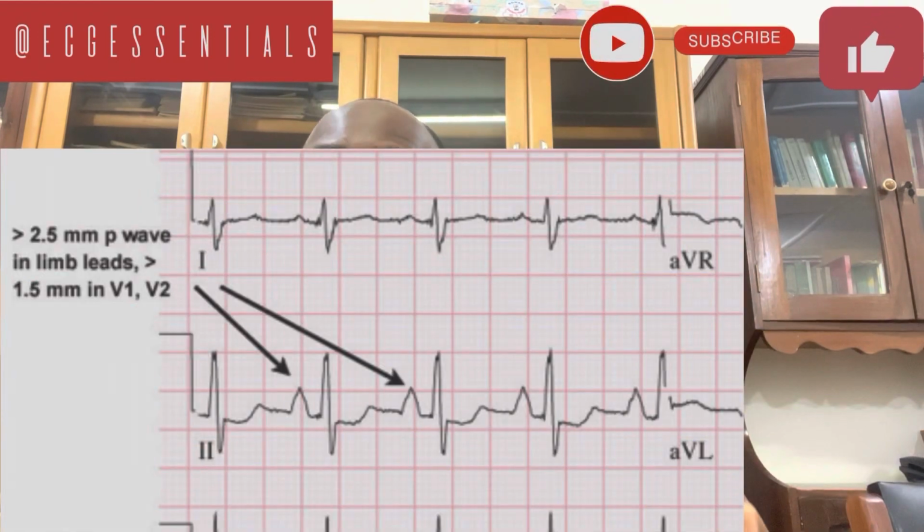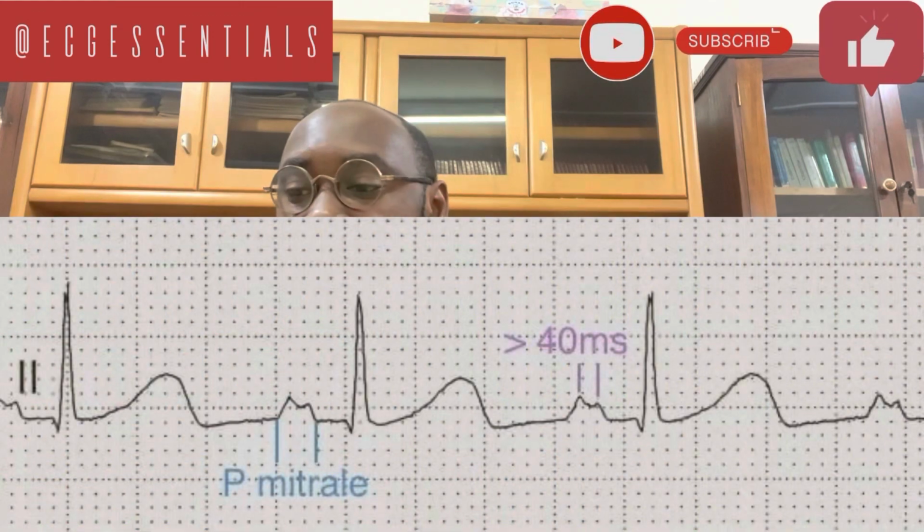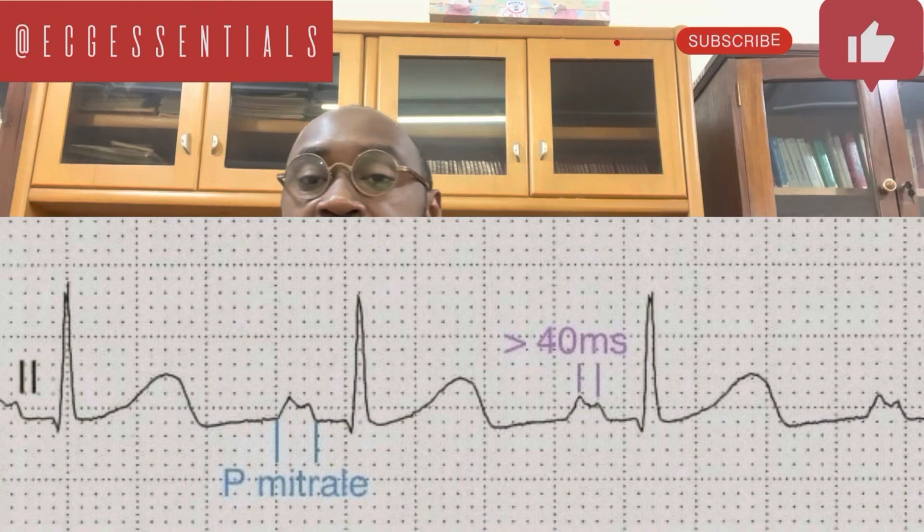All right. So in looking at the P waves, apart from the few things that we have mentioned earlier, other things of interest will be whether there is a P wave enlargement, right or left atrial enlargement, so whether there's P pulmonale or P mitrale. We are also interested in P wave inversions, which may be the case in atrial or junctional ectopic rhythms.